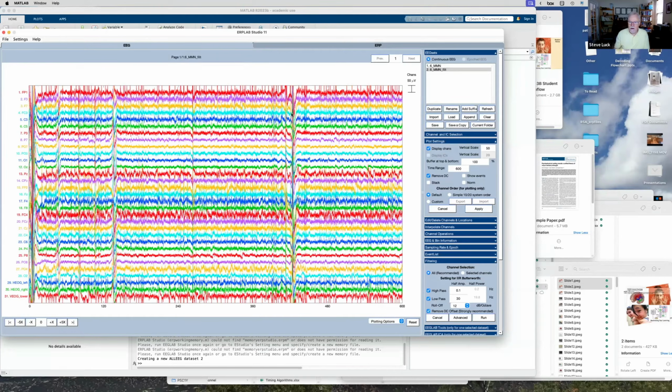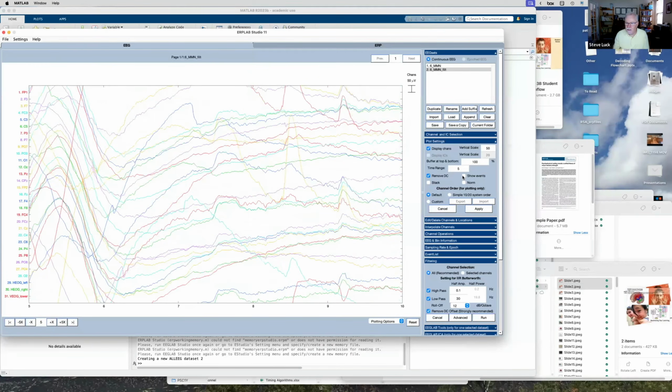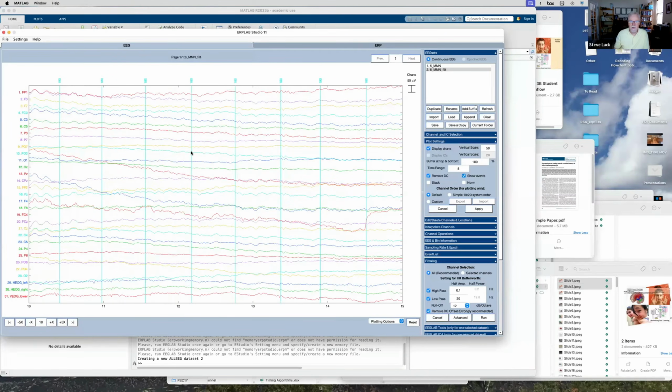Now there are a couple of weird things in the data, some points where the subject did something weird and created a large artifact. So we can easily see that here, or we can go back to 5 seconds. And you can see all this junk at the beginning because this is before the trial block has started. I want to show the event codes again. Okay, but once we start getting the stimuli coming, the subject calms down and the EEG is calmer. Okay, so let me say just a couple of words about artifact correction.